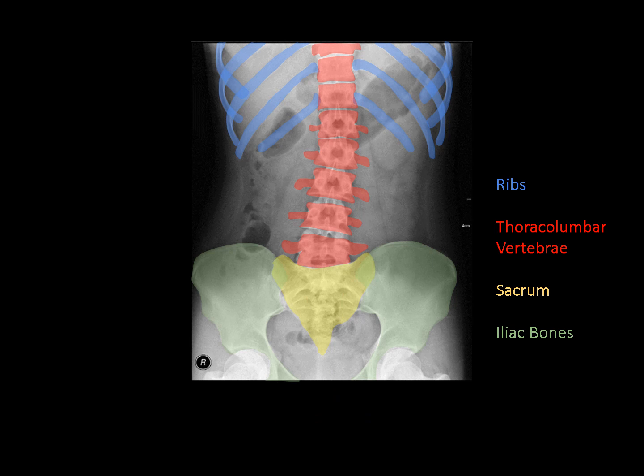Moving on, we have your iliac bones forming a large part of the pelvis. You can even see just one sliver of the pubic bones as well. And you can also see your acetabuli bilaterally, where your femoral heads articulate to form your hip joint. And then of course we also see our proximal femurs and most prominently the femoral head, so that rounded area of bone that's articulating within the acetabulum in the pelvis to make the hip joint.